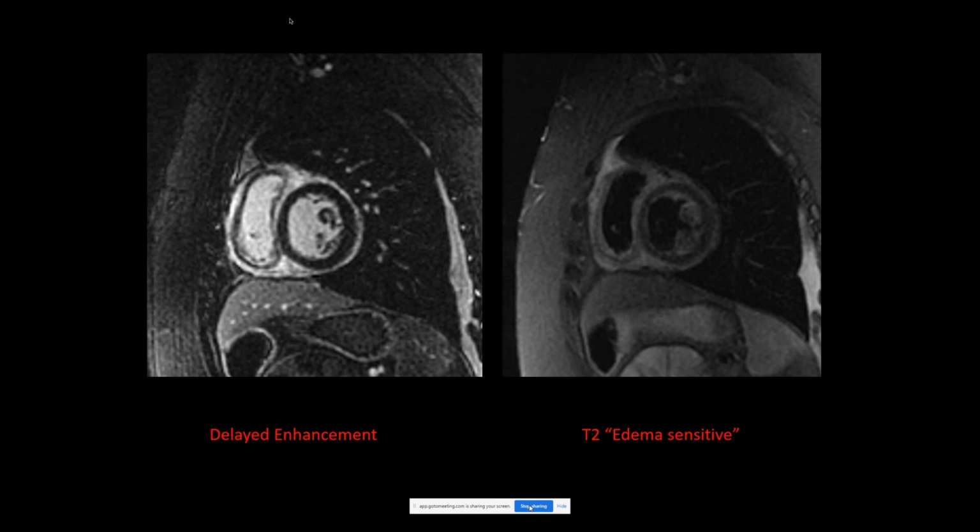We're also now using a deep learning denoising algorithm, which really helps with these images a lot too. This image doesn't have it, but what we're getting now are fairly consistently better than this, I would say. Nice, very good. That's great.